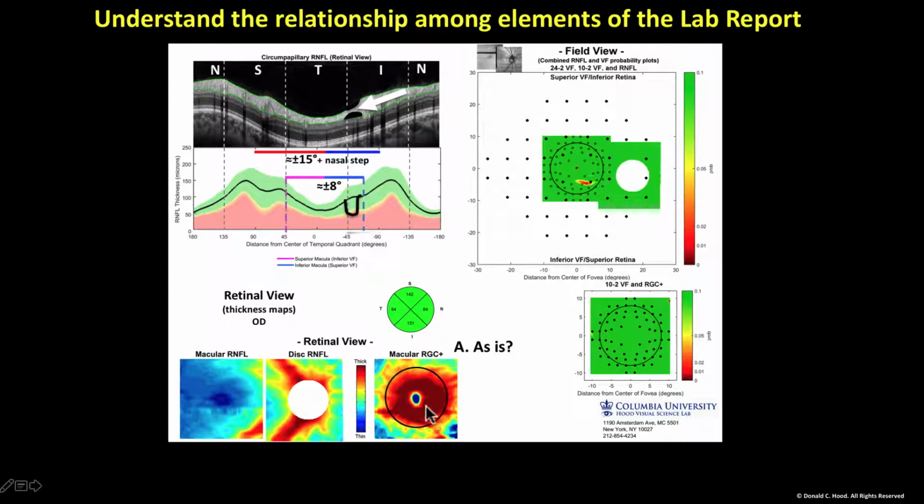So then what should we expect happens to the ganglion cell thickness map, right? Should it appear like this? Well, no, not really, because after all, this defect is in the macular region here. So what about this? Should it look like this? Well, no, that doesn't look right, because this up here is in the lower retina, and this is in the upper retina. That can't be right. What about this? Oh, well, that looks pretty good, doesn't it? This defect here should be at the edge of the macula, and it should be in the inferior retina. And sure enough, it is.